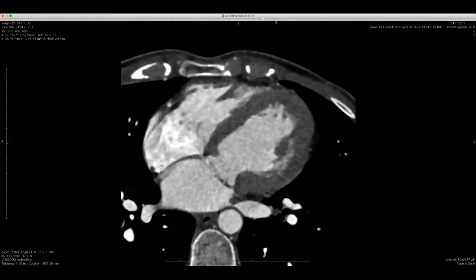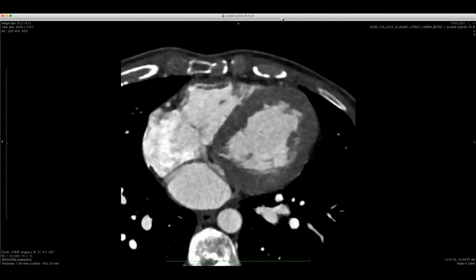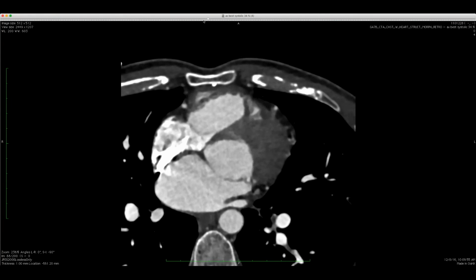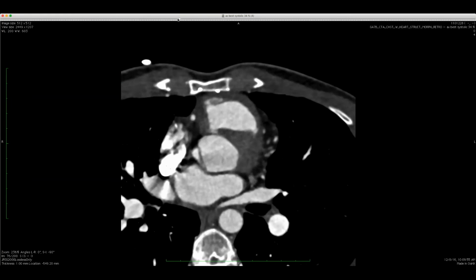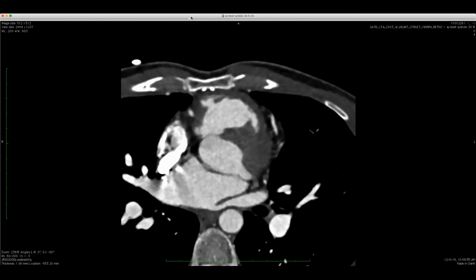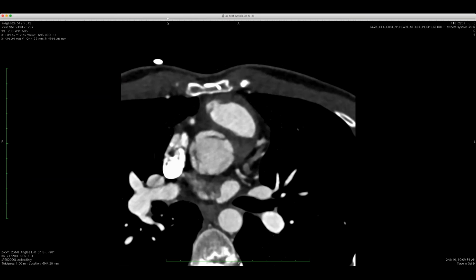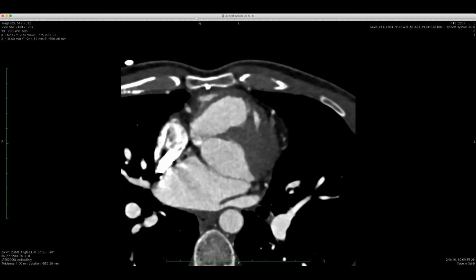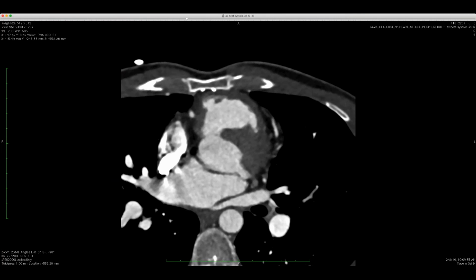So just a couple this week. This is a soft tissue density, likely young patient who has follow-up here with us for Williams syndrome, and the things that we're familiar with in Williams syndrome are a supravalvular aortic stenosis, and this patient had already had repair of that at this time, and you can see the sternal wires here.